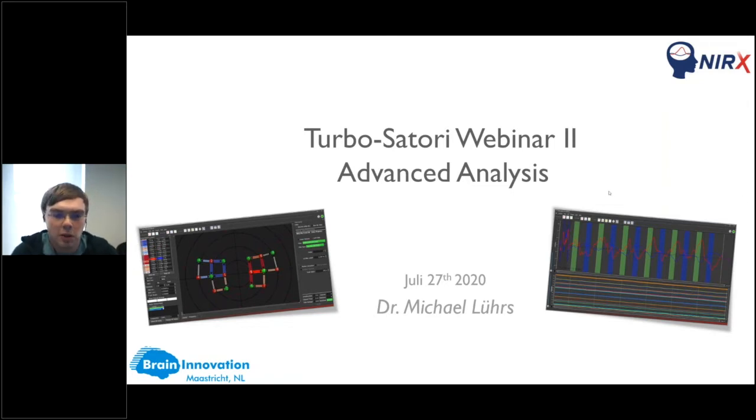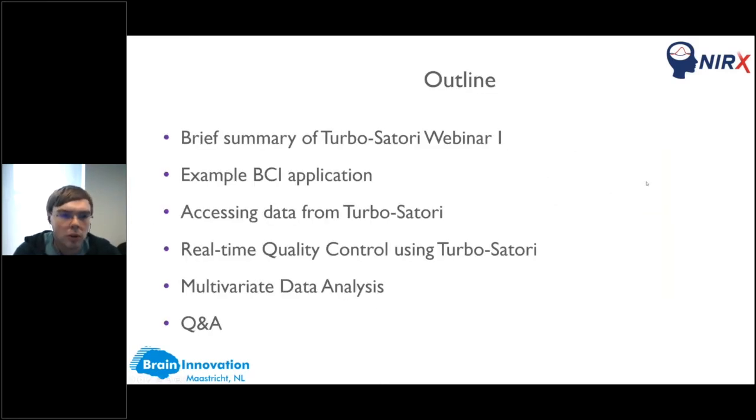I would like to begin with a short outline of this webinar. We will start with a brief summary of Turbo-Satori Webinar 1, for those of you who missed it, going shortly through the steps, showing the software and what you can do with it. Afterwards, I will show you some examples of BCI applications that you can do with Turbo-Satori. And one of the most interesting questions, I think, is how you can access the data. If you want to set up your own experiment using maybe your own presentation software, how can you get the data from Turbo-Satori?